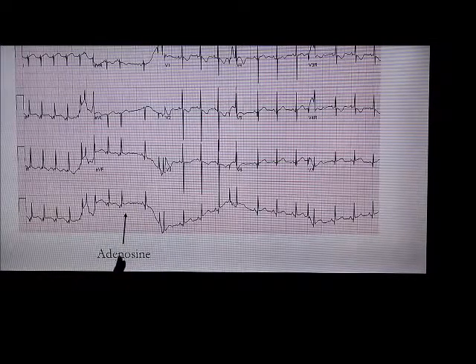So after adenosine it converts back to sinus. If you see the P wave morphology, the rest is actually normal. Upright in V1, biphasic, and then it goes back upright, in the precordial leads and the right-sided ones and lead II too. So does this help you? Does it differentiate which one of the three? Normal differential diagnosis. Okay, so what does this exclude?